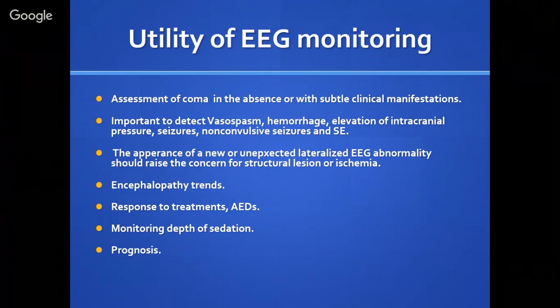Okay, we always have patients with post-traumatic injury who have to be placed on propofol, and then you can assess to what level the critical care doctor or the epileptologist or whoever is taking care of the patient wants them sedated, and they usually try to go for the burst suppression pattern that we'll talk about.